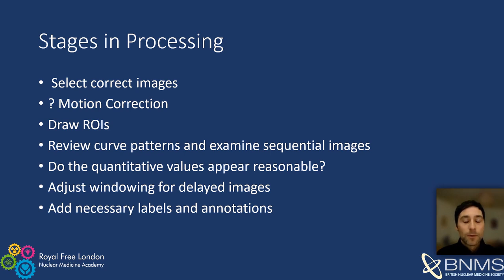In some cases, however, anterior images may be necessary, for example, in transplant renograms, where the kidney will lie more anteriorly. When the kidney depth cannot be assumed, in the instance of pelvic or horseshoe kidneys, both anterior and posterior images should be used to determine the geometric mean for accurate processing.